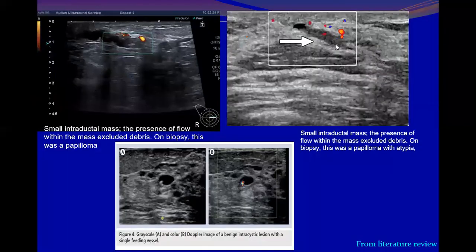These are examples of a duct demonstrating intraductal vascular echoes. That means these definitely are not nonspecific secretions. These are soft tissue. We have to go further to give a pathological diagnosis for this soft tissue. In both cases it was a papilloma, while in this complex cyst there is a soft tissue component with feeding vessels here.